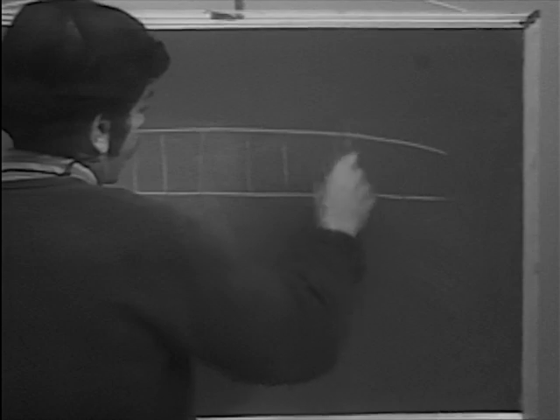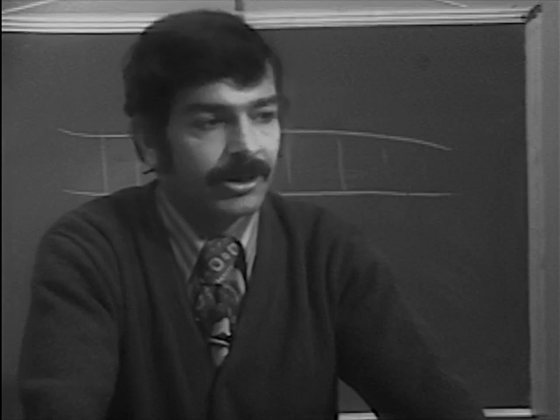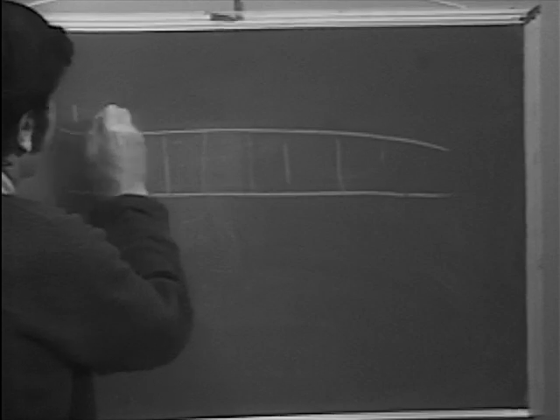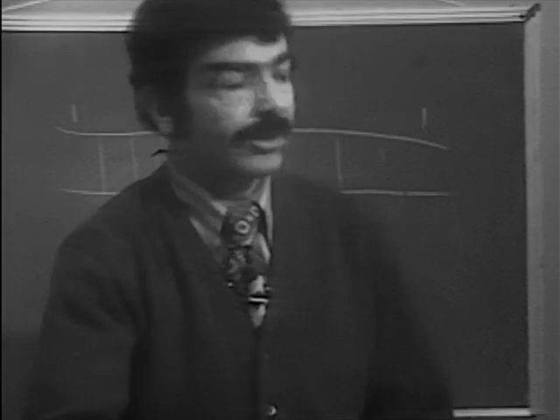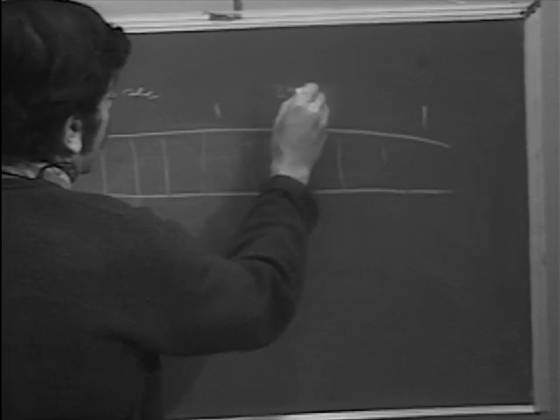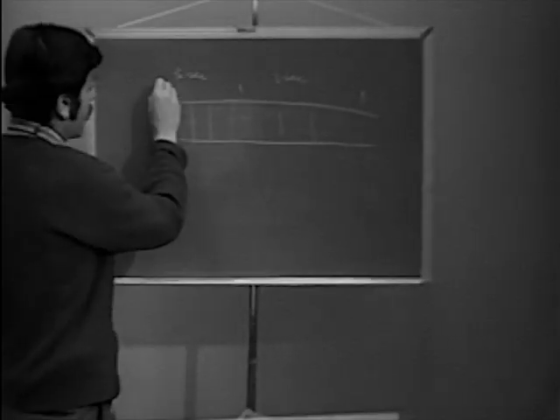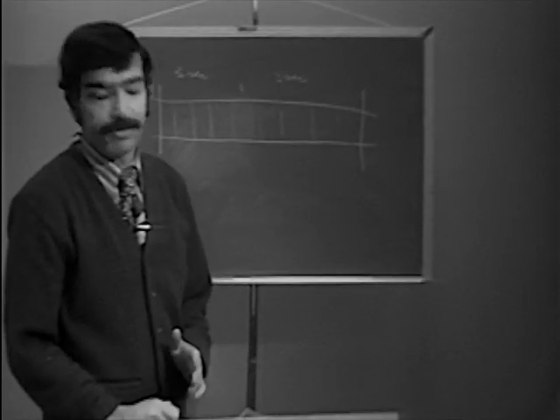All right, now if you take a look at an electrocardiogram, this is an example of an electrocardiogram with the divisions appearing as I've roughly drawn. If you look at the top of the paper, you'll notice that there are small vertical marks, and these small vertical marks occur at 3-second intervals. So what we want to do is count the number of beats in a 6-second strip.